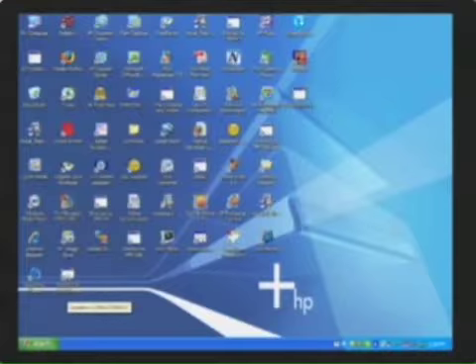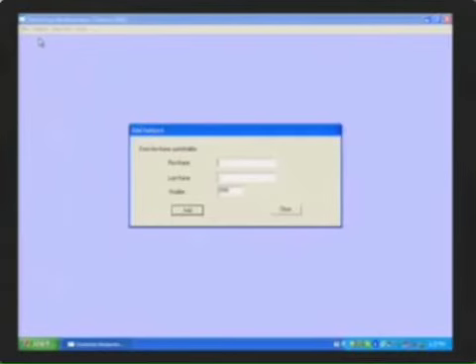Start by bringing up the SMS program on your computer screen. I have mine set up with an icon on the desktop screen. Be sure to note the names of the clever people who devised this system. On the top row, you will see several labels. Click Add Subject, type in the number 1 as the first name, and the word Sample as the last name for Sample 1. Click on Add and then Close.